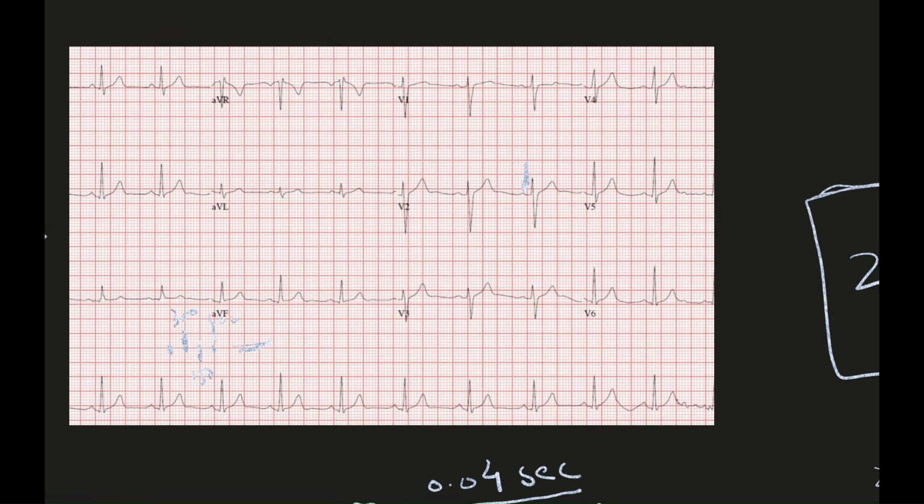So this is 75 and 60. If you calculate how many small squares there are between these milestones, there are 5 small squares. The heart rate from here, this is the 75 milestone and this is 60, so there are a total of 15 heartbeats from 60 to 75. 15 heartbeats. If so, how many heartbeats can be assigned to each small square?